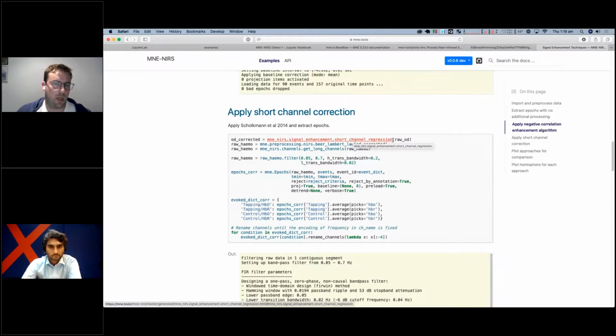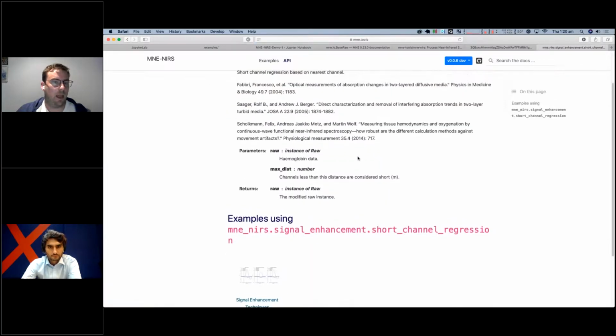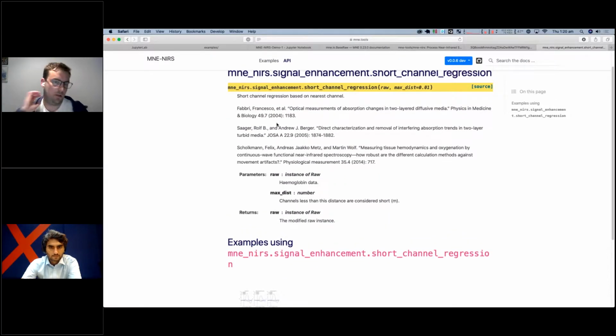So there's this technique called short channel regression, and you can find the references that I used to write it here. It's available. I didn't have time to run through it today, sorry. We also talked about this in another webinar, which was about analysis of short channels data in detail, so you could always go back to that. Yeah, I watched that seminar. It's the same technique that's done here.